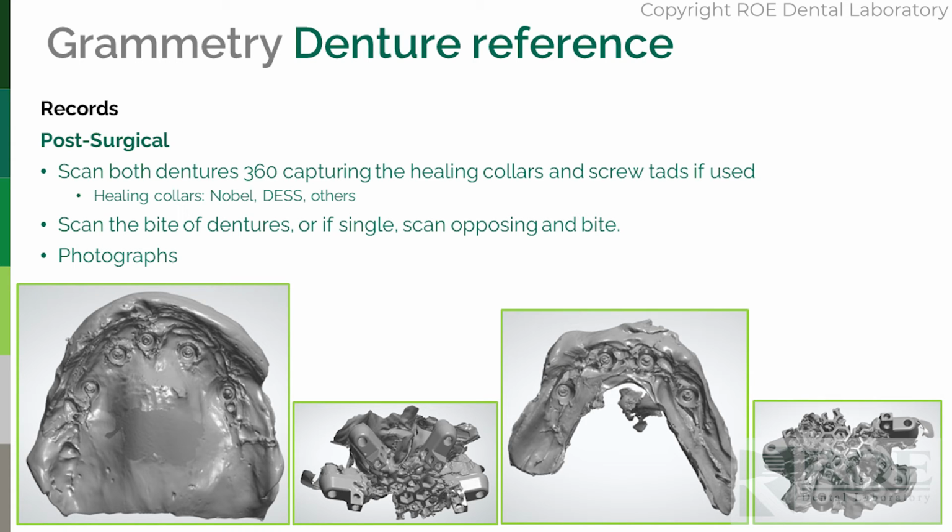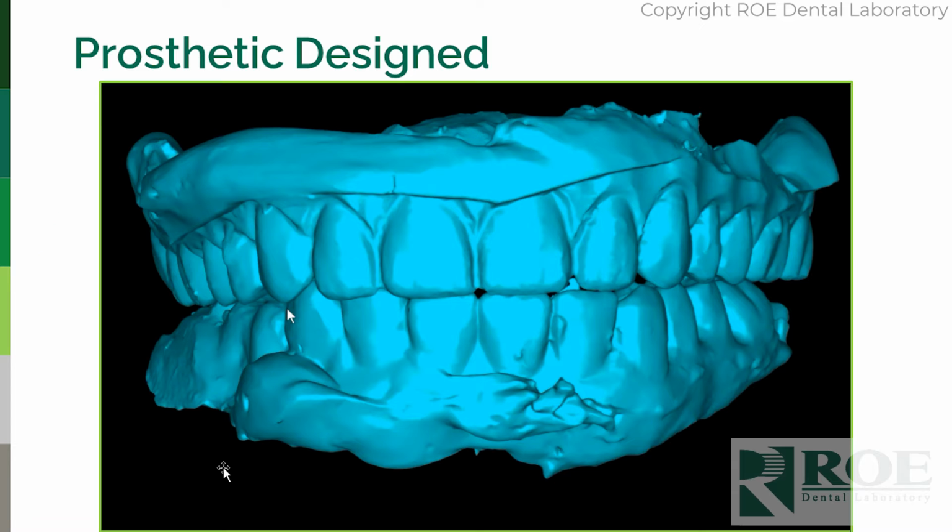You see these are intraoral scans. We don't want them intraoral, we want them extraoral for the accuracy. Okay, this is what you upload. Basically three files, because these will all be in one event, and then the other event will be the OptiSplints. Upload that, we make you a prosthesis.